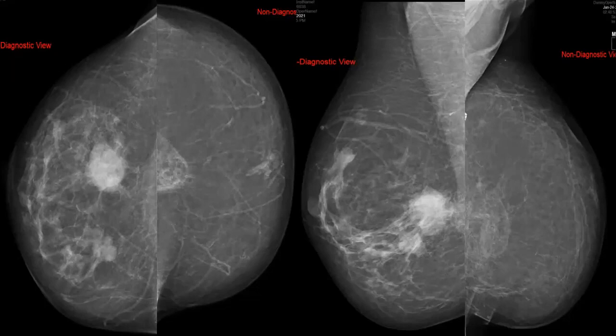Is it a normal breast? No, it showed also an area of focal asymmetry, also more posteriorly, in the same location as the mass in the other breast. There is calcification high up. And if I told you this patient had a history of left breast cancer 17 years before, it could be a local recurrence of the breast cancer with mets to the contralateral breast.